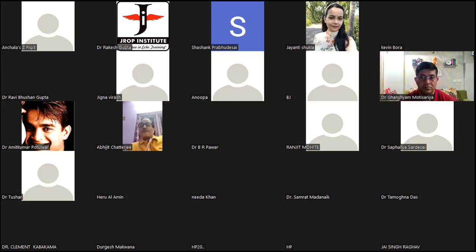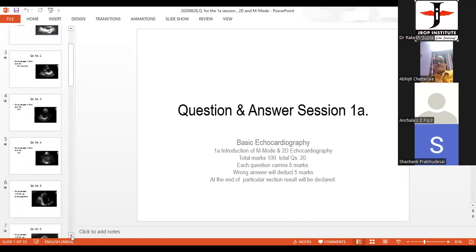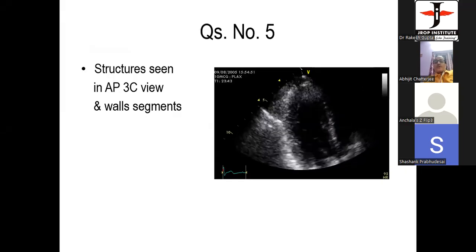Shashank, wait a bit. We will show you another picture. So, Shashank, what view is this?